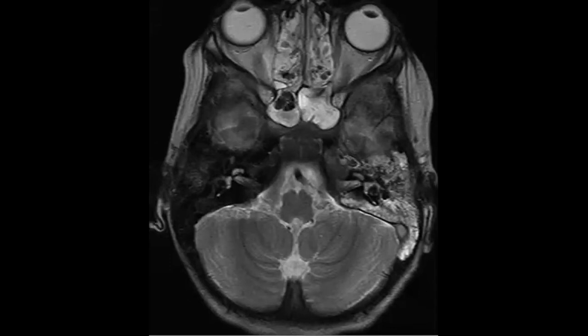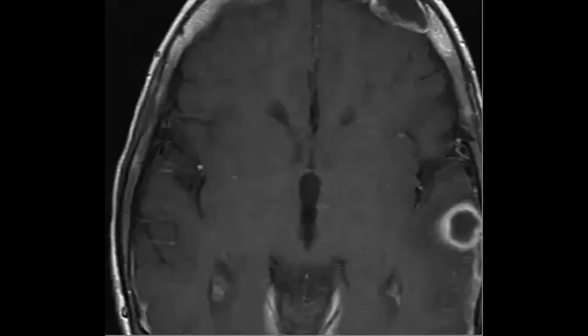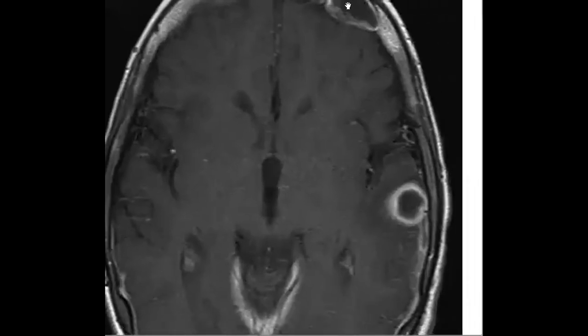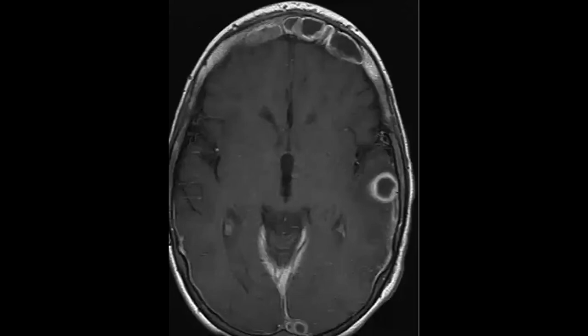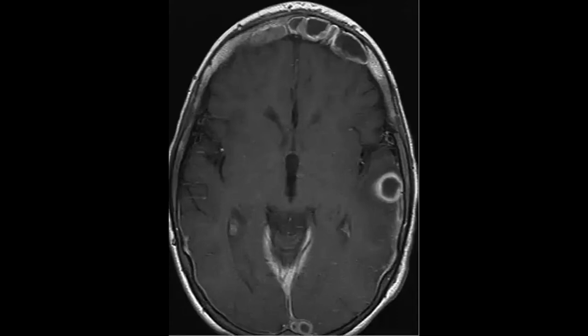So what we can do now, let's shift to another image. I wish that we cover everything here. Now, what about this image of the same patient? Okay, so now is the time to see. The same patient, what happened in this image?